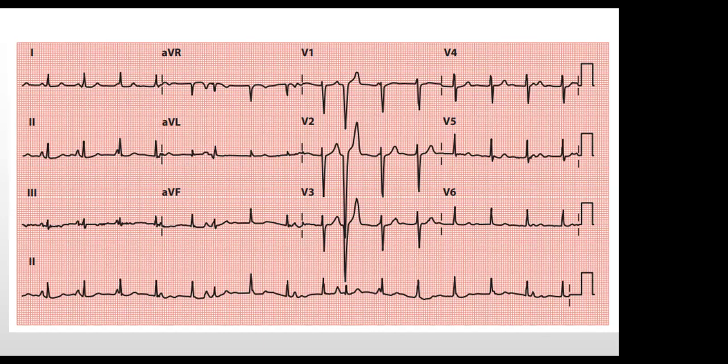Just assume that you want to report this ECG. So what's the first thing that strikes you? The first thing that strikes here is that there are no discernible P waves. I can't fully make out a P wave here, sincerely.